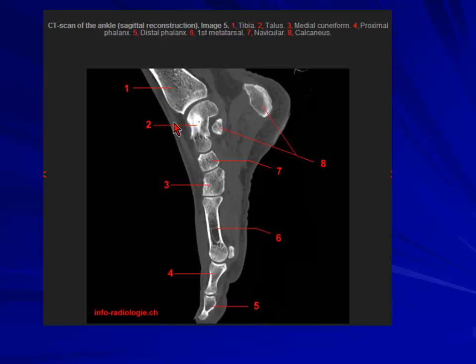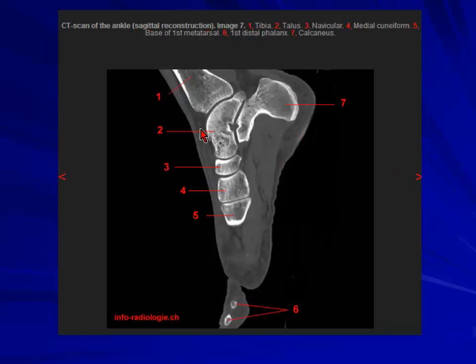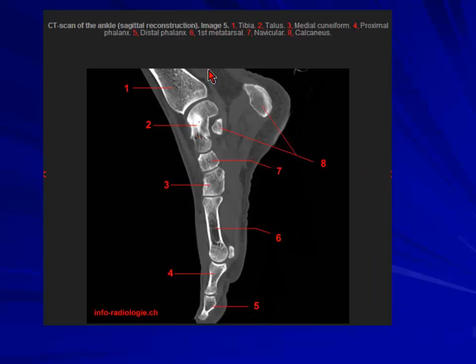These are the anterior compartment, and that's probably tibialis anterior coming in. And this is the posterior part, and probably running through the medial part is maybe tibialis posterior. I may be wrong, but I think this runs through and attaches here. So that's tibialis posterior. So they've got a fat plane here.